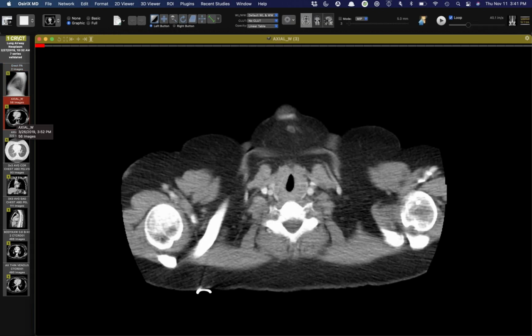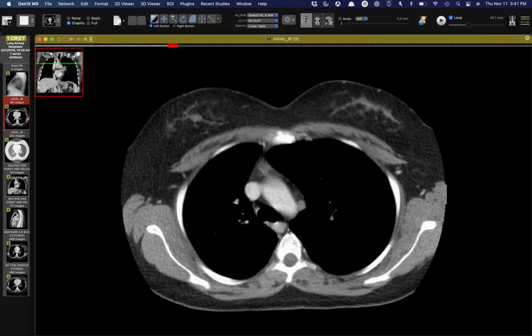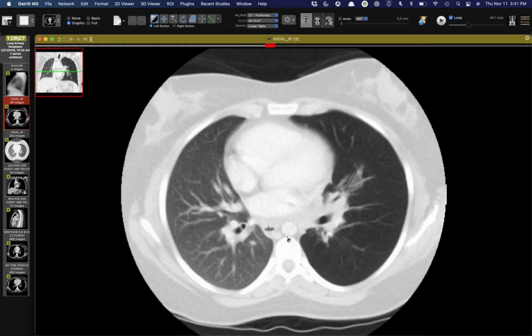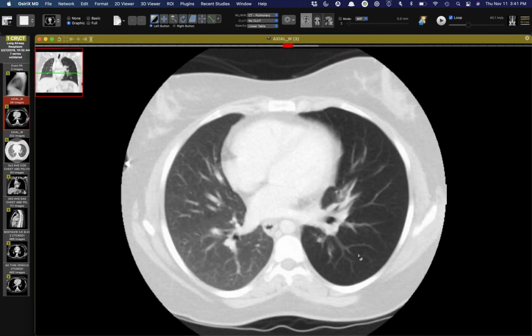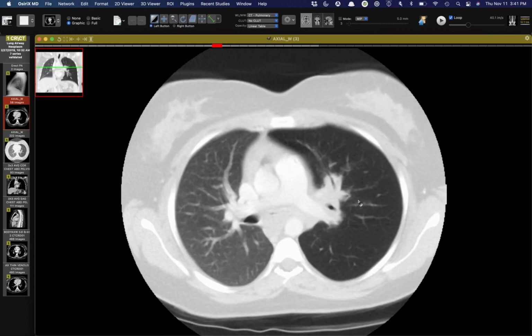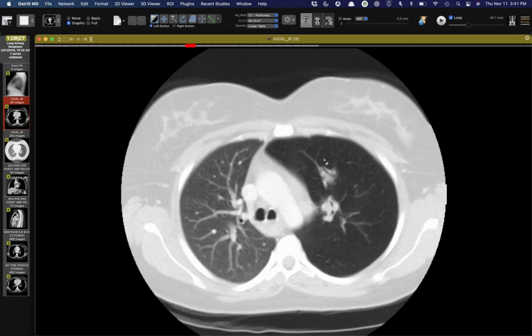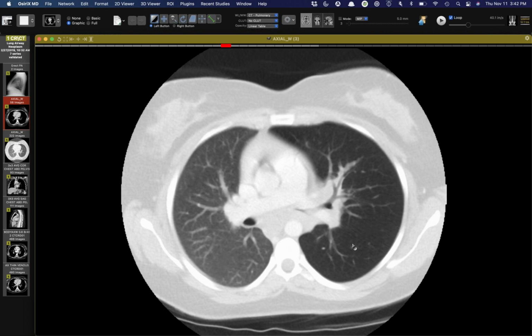Here's the CT, and I'll show this original CT. It's unfortunate that people still do 5mm slice thickness images, but you'll see the cause of this. I can start on lung windows just so you see that this corresponds to just an overinflated left lung, as a result of obstruction of the left main stem bronchus, and we'll get to that in a moment. And I think also relative hypoxemic vasoconstriction as a result.